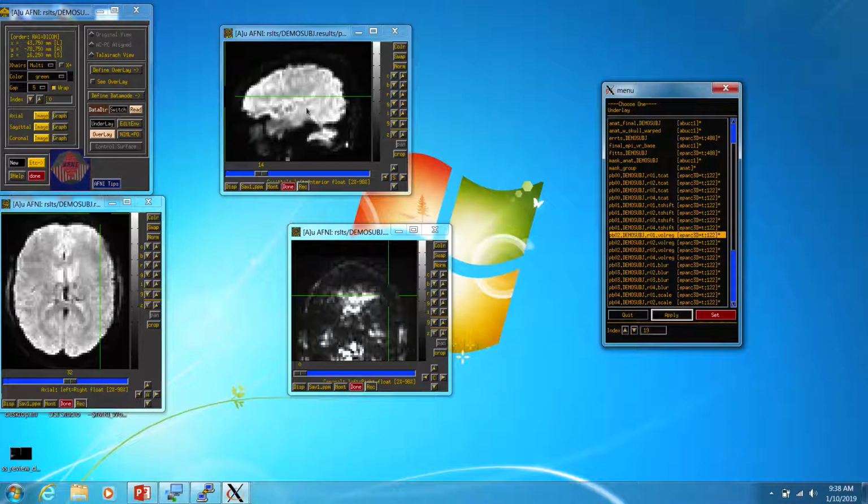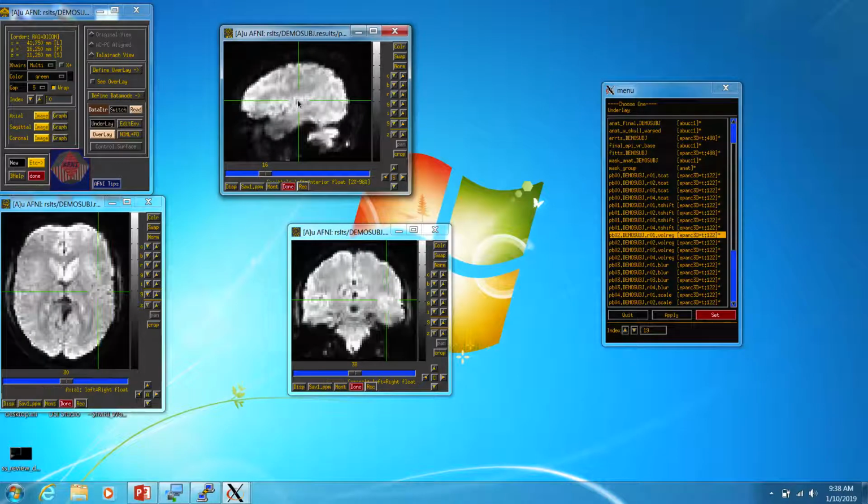So let's get in the proper part of the brain here. The big thing you'll notice is the activation starts to look a lot more brain-like, what we're used to seeing in terms of a templated brain. And that's because it's applied all of those warps that it got from the anatomy. And you can see a little bit of ghosting here from the skull. If you'll remember in that warped image that still had the skull, it kind of bent, you can see that here. So at the volume registration stage, we have a much more clear brain, and it's clear that it's in kind of this templated space.